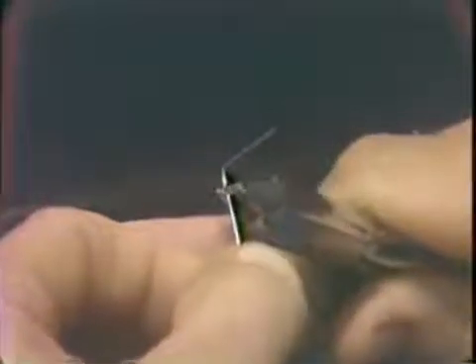I'm going to switch pliers to the 139 to start the folded back portion. Compare it to the wire already constructed.